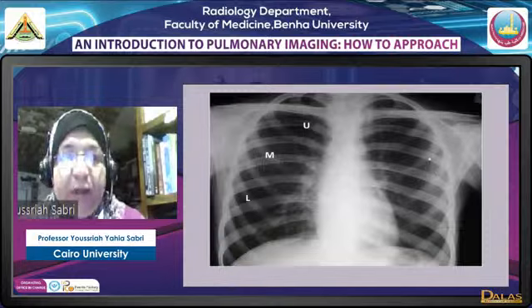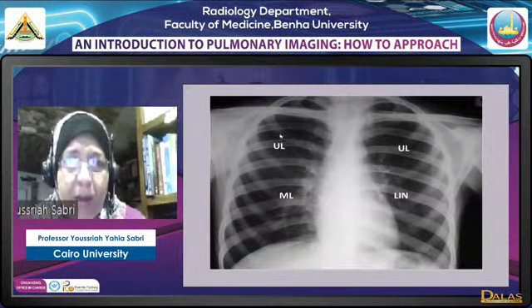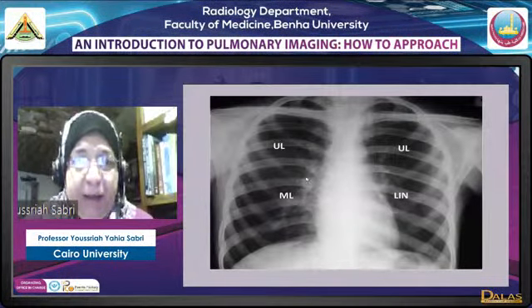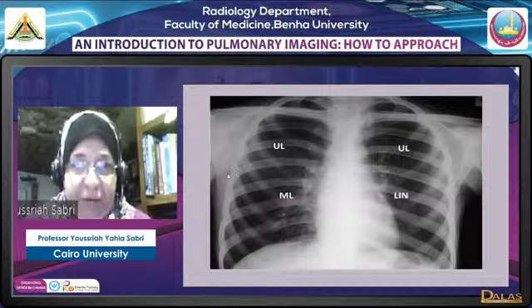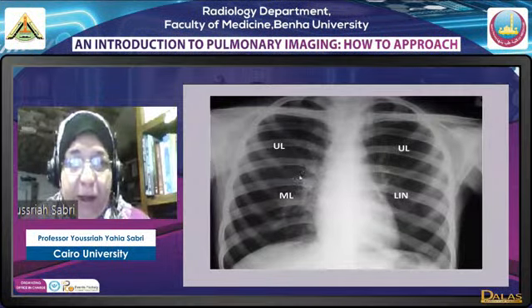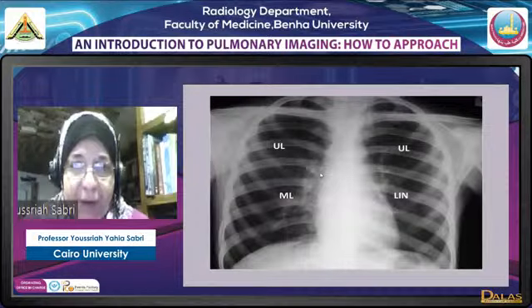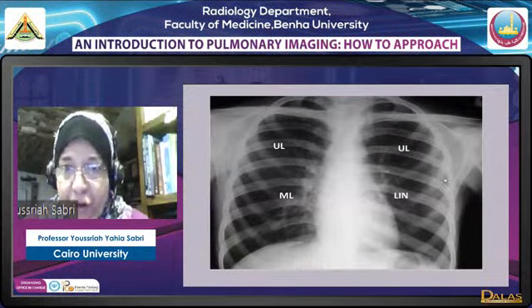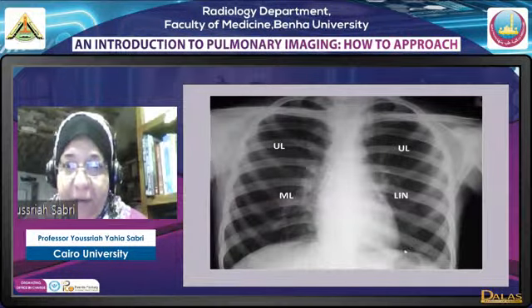There is another way to describe the lesions: lobar. The upper lobes, on both sides. Quite simply, this is the hilum, extending a line from the center of the hilum peripherally. What is above this line is a triangle on both sides, representing the upper lobe. Then we join the tip of this line to the cardiophrenic angle, and with the cardiac border we have another triangle. On the right side it represents the middle lobe, and the left side is a mirror image of this: we have the upper lobe and the lingula.